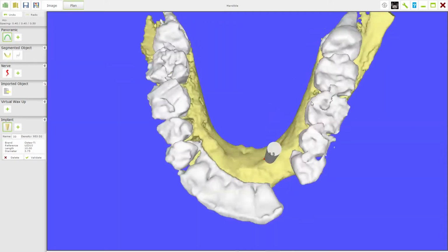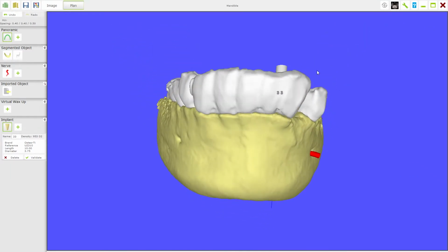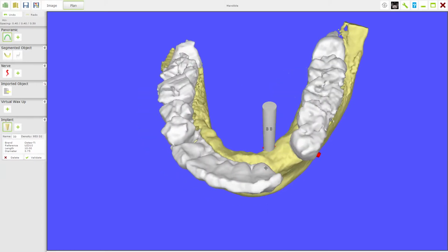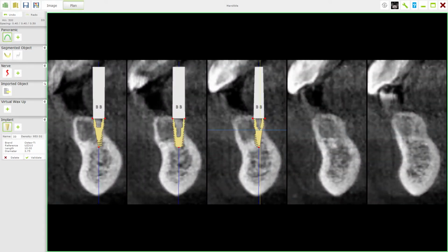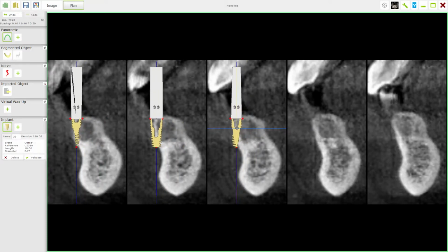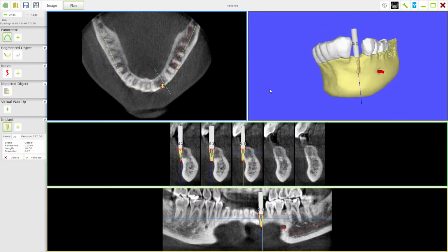So now our implant head is here. The implant is within bone, but because this is all bone, remember, there's no gingiva, this is the bone. But could we restore it? No, our implant head really needs to be as buccal as we possibly can have it, but the problem you find is when we take teeth out, we lose buccal bone, and this invariably means that it's very difficult to position the implant optimally. For optimal positioning, in this case, we really need to have it somewhere like there, and from a restorative point of view, that is far more restorable.